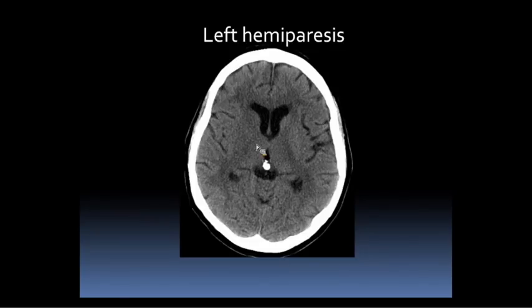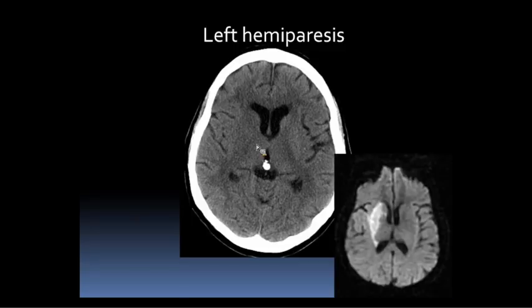It kind of looks similar to the white matter. So sometimes the hardest thing to see is what's not there. It's one of these eye test kind of things. But again, once you know what to look for, then you see these things. And so this is the MRI that was done, the diffusion, which shows the infarct over there. So yeah, as I was saying, the majority of people with acute MCA infarct will have some basal ganglia changes visible even at 3 hours.